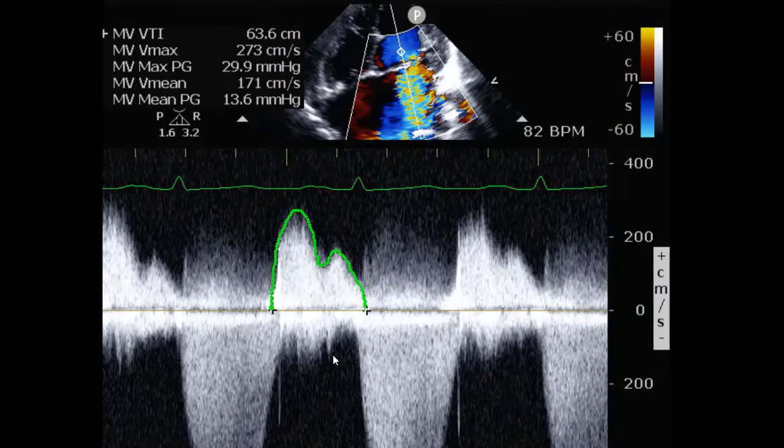That is information regarding the mitral stenosis. In order to calculate and assess mitral stenosis, we will need to look at both the mean gradient and the pressure half time. Again, these are measurements that are heavily reliant on Doppler. And if your Doppler quality is suboptimal or you're not quite on angle with the jet, you can get some false calculations. That's why in the case of mitral stenosis, if you can get a transesophageal echocardiogram, or use 3D technology, to get an effective opening area, it really is a gold standard for assessing mitral stenosis.